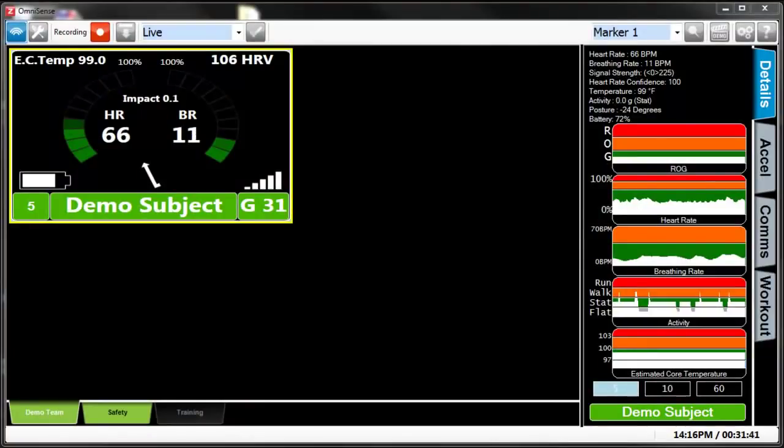In this chapter, we will overview user preferences, including markers, sessions, session names, safety zones, training tabs, and speed zones. Keep in mind, for a quick reference, you can access our user manual by clicking on the question icon at the top right-hand corner of your screen.